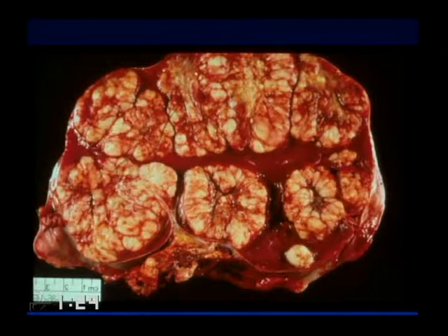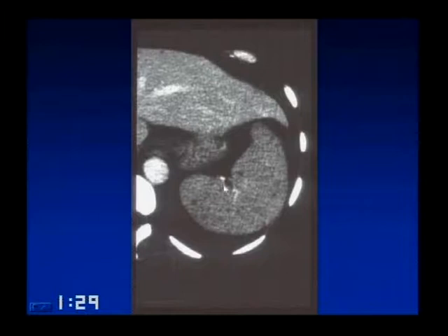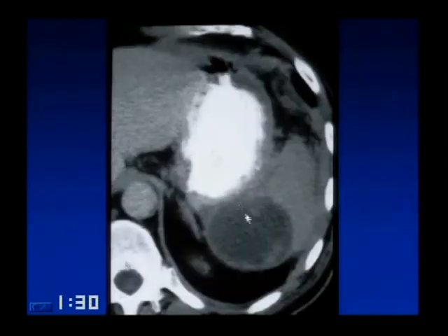Extensive involvement, multifocal masses in the spleen, and on CT, these lesions can be ill-defined, multiple lesions enlarging the spleen, and they're going to definitely be more obvious on infusion. This is an example, I've had just a few of these, that mimics the microabscess pattern I showed you for candidiasis. So this is a normal-sized spleen with lymphomatous involvement that has a very sandy texture with multiple small punctate hypodensities. Here's a single larger lesion with some central necrosis, and another lesion that for all the world you might think is a cyst, but when you look at it on delayed images, you can see that there's actually mural nodularity. And this patient has a known lymphoma.